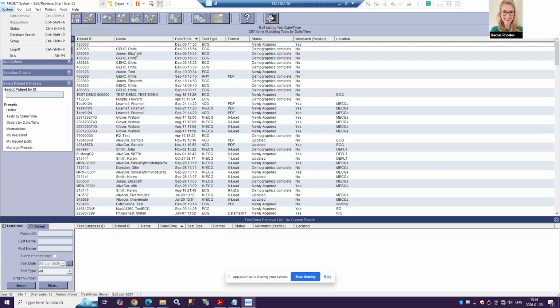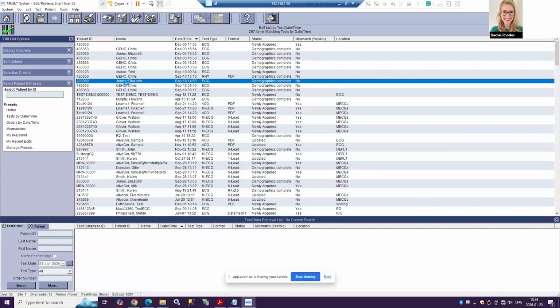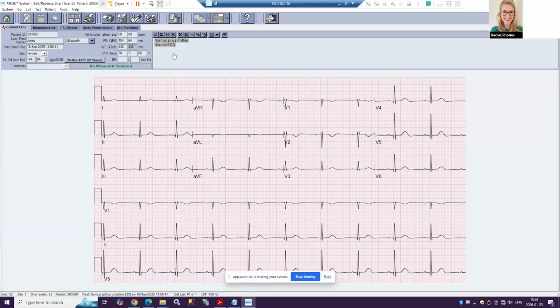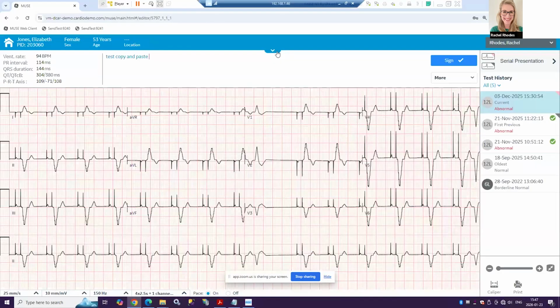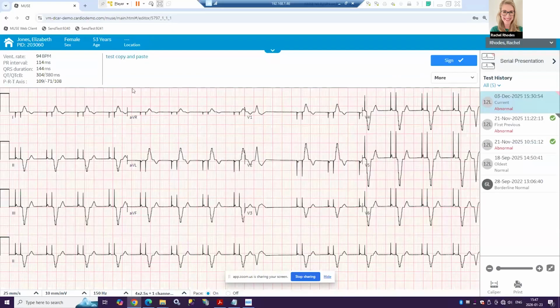The other option that I think I showed earlier is we can add on a specific study reference code that you can generate in your statement library. If I start typing on here, you can see I've made a pretend study reference and I would search on this number code. Or when you're taking the ECG, if I go back into the web client, you can have an extra question here, or you might do it via a location ID or something along those lines. So it needs to have a reference that we can search on to pull that data.